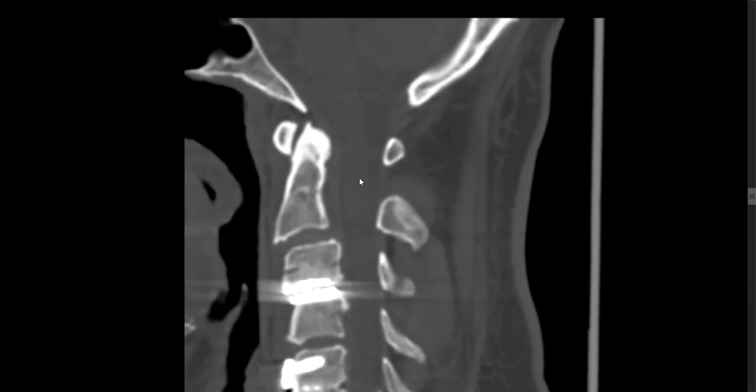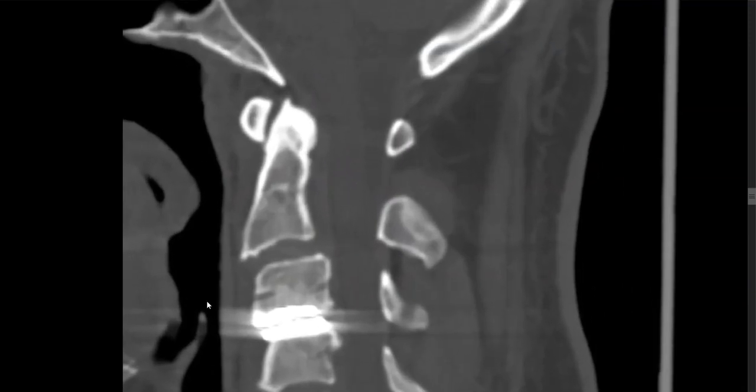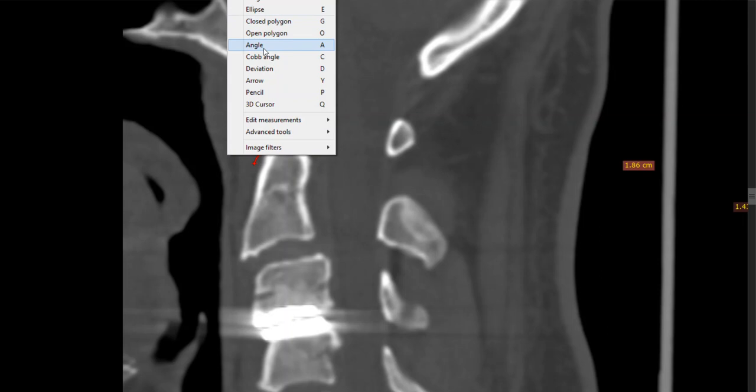I'm going to move this down, increase, and go to length, but we're not going to be using the length tool. So here, get rid of that, is the V sign, which is a transverse occipital ligament, which you normally don't find in too many anatomy books.